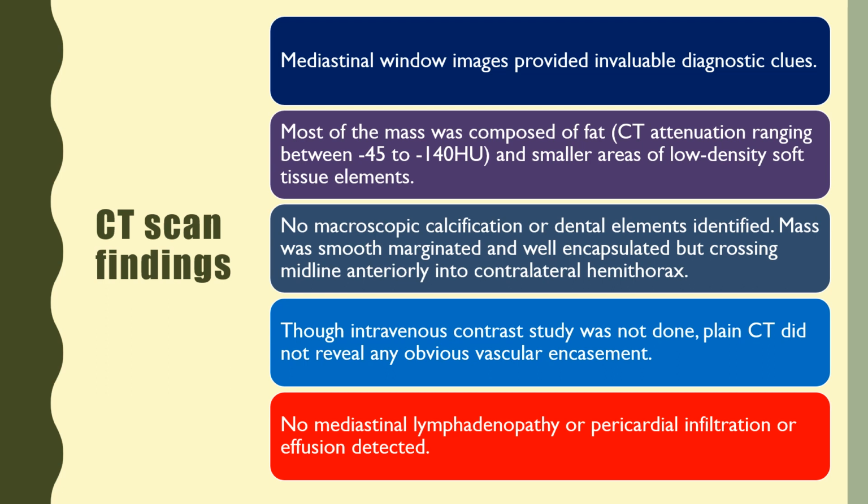The mass was smooth marginated and well encapsulated, but crossing the midline anteriorly into the contralateral hemithorax. Though an intravenous contrast study was not done, the plain CT did not reveal any obvious vascular encasement. No mediastinal lymphadenopathy or pericardial infiltration or effusion was detected.